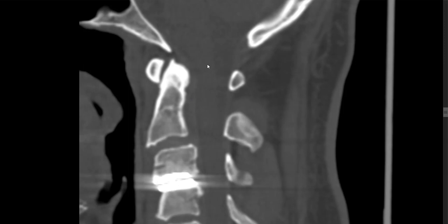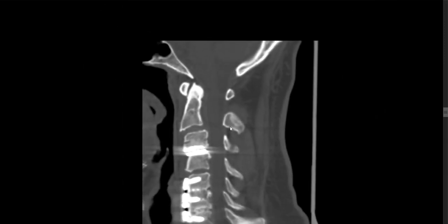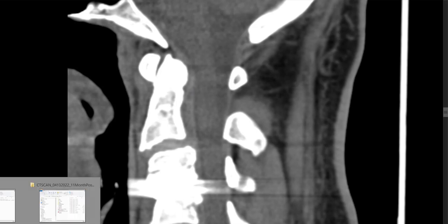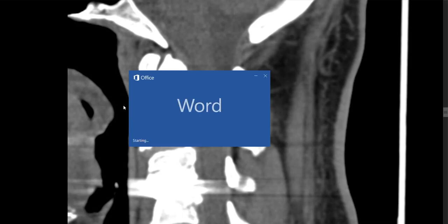Now let's look at, I can already see the brainstem here, and it's close. How can I show you this? So you can see right here, this sliver here, and then this tissue. So this is what likely is a pannus. A pannus is, I should probably pull up a Word document so I can actually type you what's going on here. I should probably take these links.